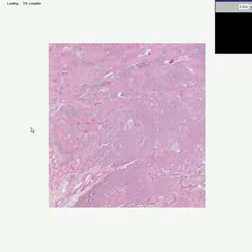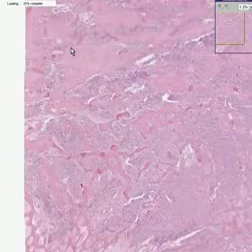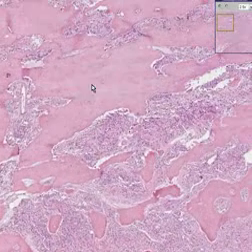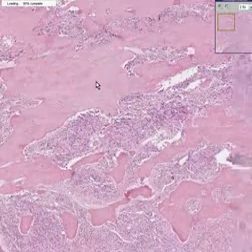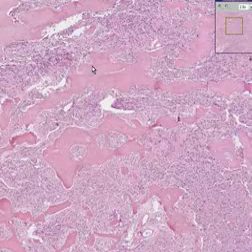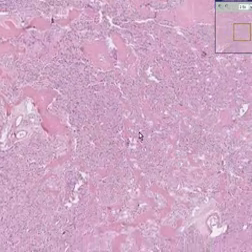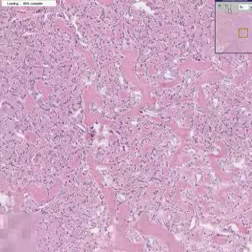Notice that in some areas of this, in this thicker, more cortical looking bone, you might get the feeling that the bone doesn't look too bad. It looks pretty well organized. However, as you get into the more cellular areas, you don't have those nice cortical areas anymore, or even spicules. Notice there appears to be rather primitive looking spicules, or perhaps even more like osteoid.